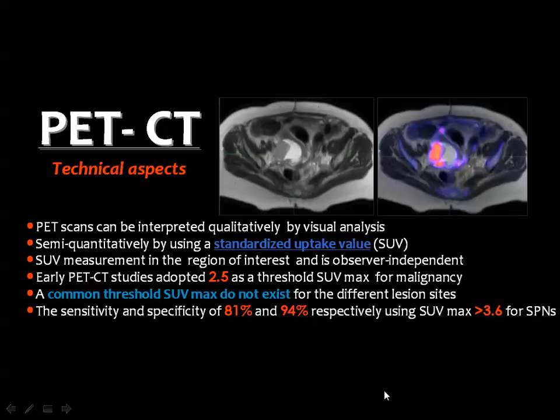Then the images of PET-CT are interpreted on the basis of the degree of uptake of the injected isotope by the lesion.